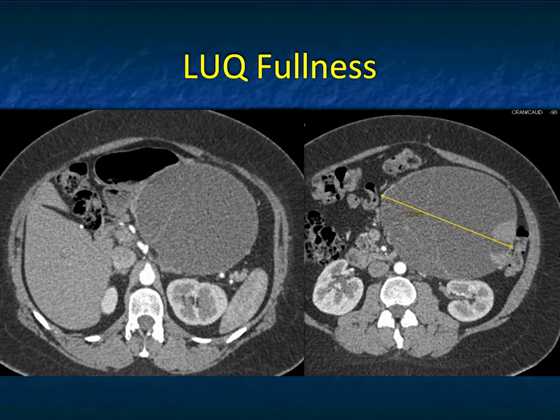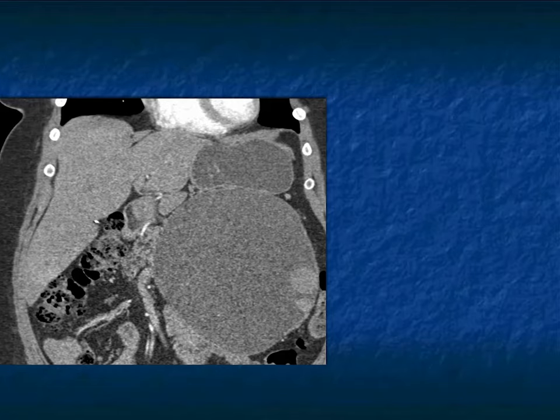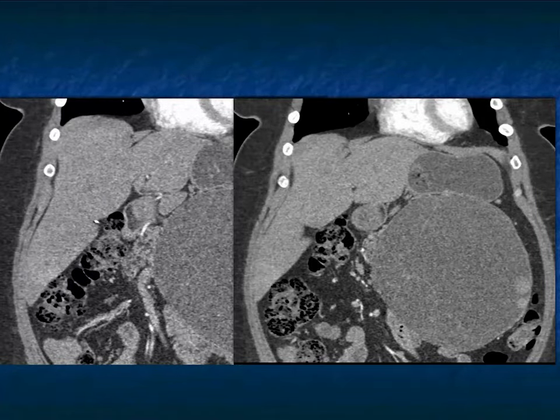When you have a lesion like this, however, just to compare, this is large, right? You're talking about over 10 centimeters. Thickened septations, but look at the nodularity. When I see nodularity, a lesion like this, I could say serous cystadenoma, but you don't get those nodules around the edge. The location is perfect for an MCN. There's atrophy of the gland. The patient's in their 40s. This is going to be a high-grade dysplasia.